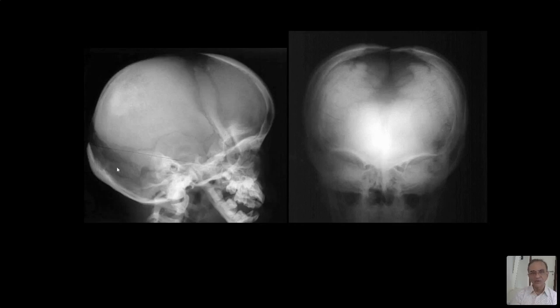So cleidocranial dysostosis and pycnodysostosis are sclerosing bone dysplasias where the skull has wide open fontanelles. In osteopetrosis, it doesn't happen. So you require just one lateral view of the skull. And if you have a sclerosing bone dysplasia and the skull vault is open, you can say that it is one or the other: pycnodysostosis or cleidocranial. I changed the order because pycnodysostosis is vastly more common than cleidocranial dysostosis, right?